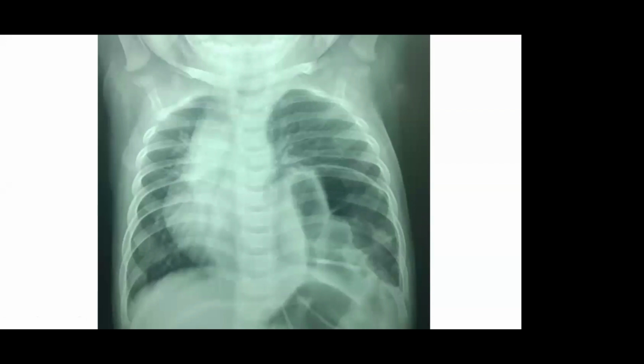This is, yes, or rather an eventration of the diaphragm. Either way, whatever you call it, this requires surgical management. So it is either hiatus hernia or eventration of the diaphragm, maybe you can call it a CDH also. That's perfectly fine. But since the diaphragm border is clearly visible, we don't call it CDH, because in CDH there is only a rent in the diaphragm. The diaphragm doesn't move up. So diaphragmatic paralysis also can lead to something like this. The hemidiaphragm paralysis could be hiatus hernia or could be eventration of the diaphragm also.